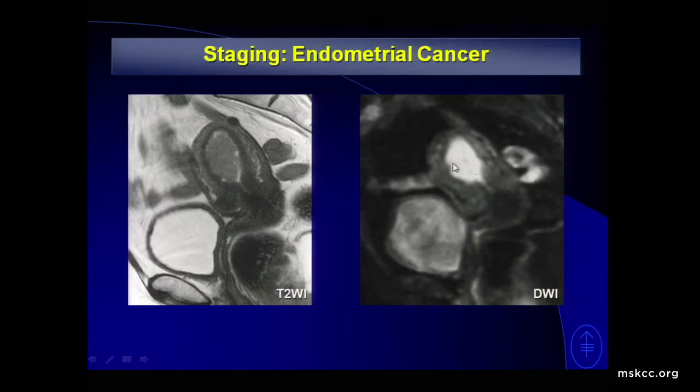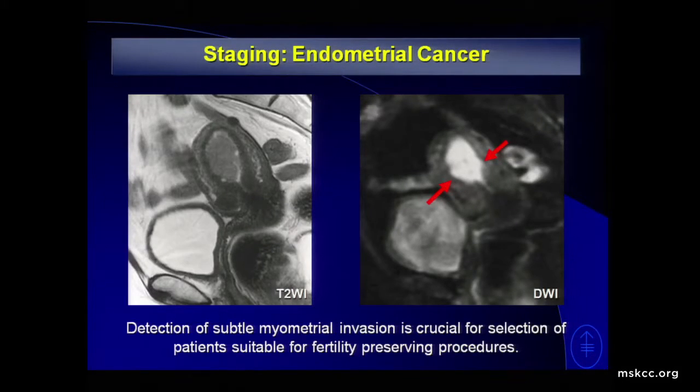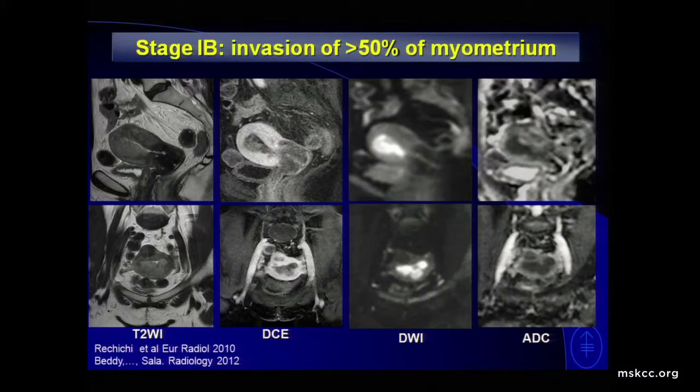On diffusion-weighted images here, it's easy: a very good tumor to adjacent myometrium contrast, in this case without any intravenous contrast agent, just inherent tissue contrast. You can see a really irregular tumor to myometrium interface, and this is certainly superficial myometrial invasion. That was the case at final pathology. This patient had a hysterectomy. You can produce this panel fairly easily, and we produce this routinely in the cases we do here, with T2-weighted images in both sagittal and oblique planes perpendicular to the tumor, for better assessment of both deep myometrial invasion and parametrial invasion in low uterine segment tumors.